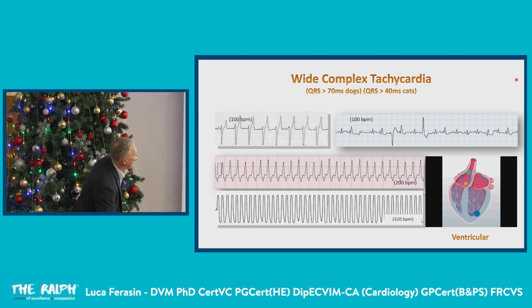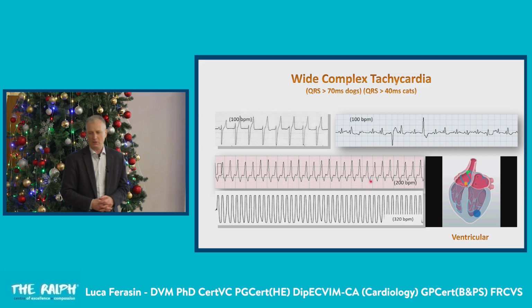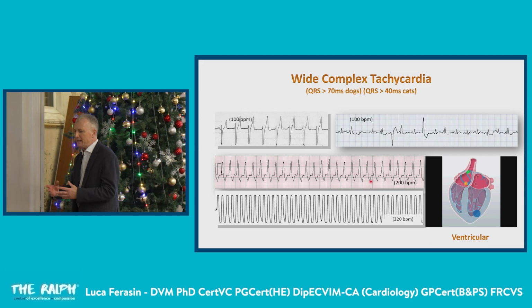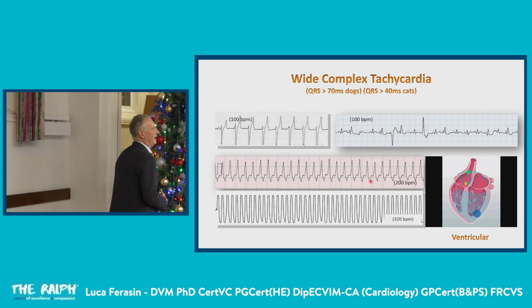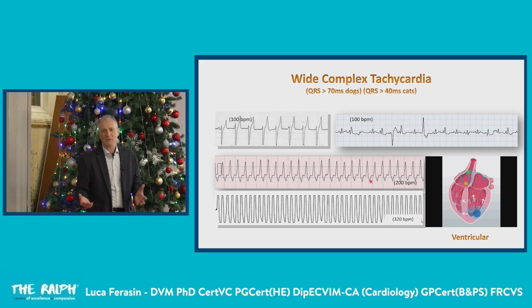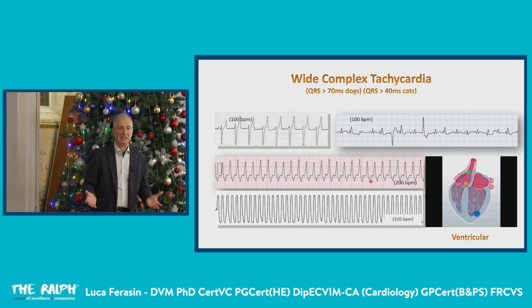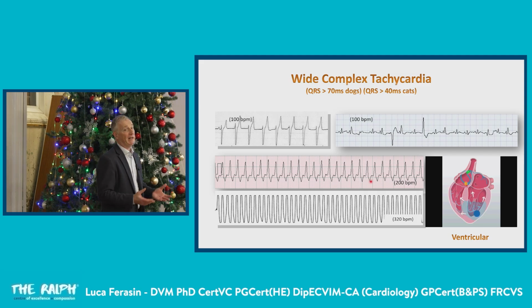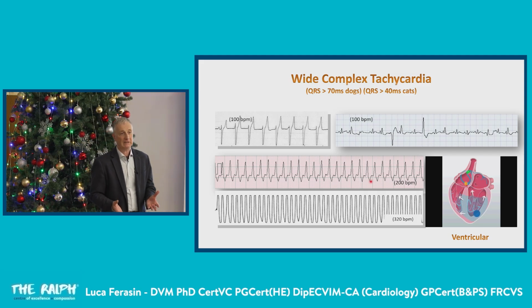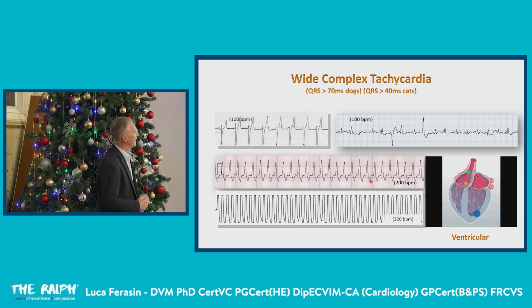Then we may have a faster rate, 200 beats per minute here, right? 200 beats per minute, depending on how familiar you are with these abnormalities, we try to be quite relaxed. We look at this, we check the pulses. Pulses are good, we just sit and wait. Other people will intervene, okay? And I'm against interventions if they are not needed.